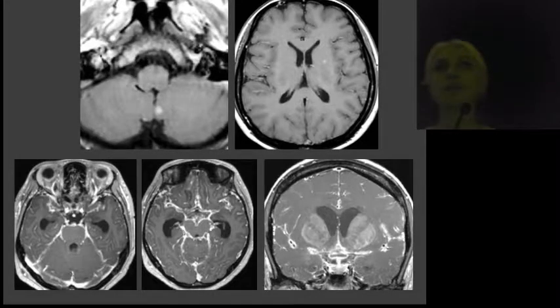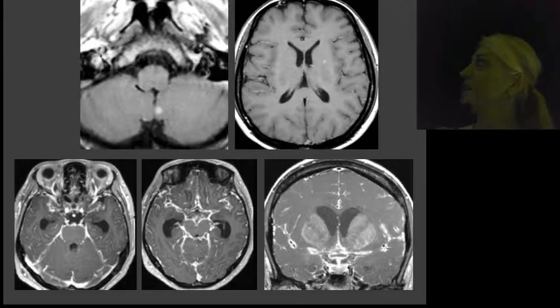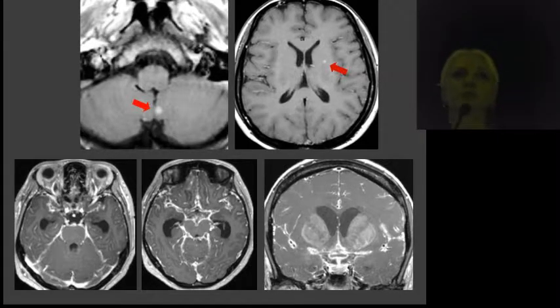This was a young patient whose diagnosis was actually missed at a small outside hospital. She had only 2 nodular enhancing lesions, one here and one here. And to be honest, who would diagnose tuberculosis based on no meningitis, nothing, just 2 nodular lesions in the brain? I think all of you would primarily think this is probably metastatic disease, and we're going to look for a primary tumor. But actually nobody read the clinical history, and the clinical history was very typical, with fever, with night sweats, a young individual. I think we still should have thought about tuberculosis.